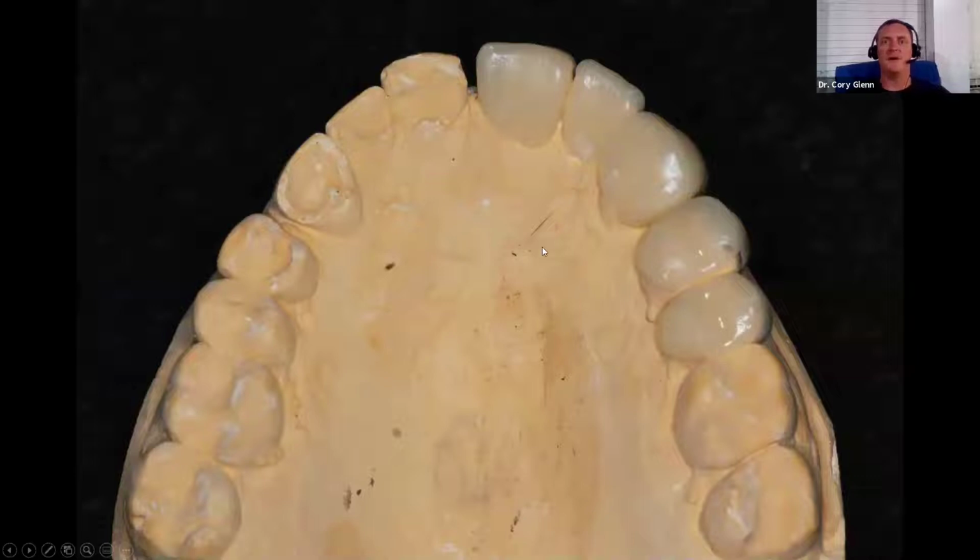Okay, so I can pre-print those. Now I made these as like the taco shell design where they cover buccal and lingual. They're easier to index. You know, he's worn his lingual, so he needs lingual coverage as well. But I'm not touching the contact of the tooth, which is preserving a lot of tooth structure. So this guy, hypothetically, if I was doing this case, comes in, we don't even touch a burr to his tooth. Maybe we use a sandblaster and just clean his tooth real well with pumice. We etch them, bond them. The restorations are tried in, and then we just bond them into place with the veneer cement.